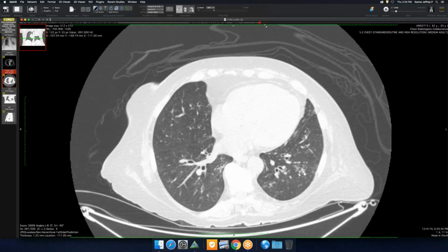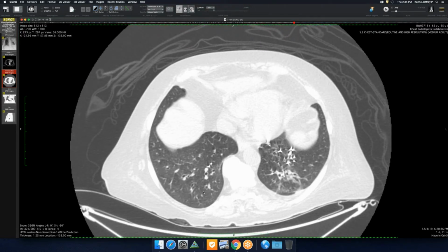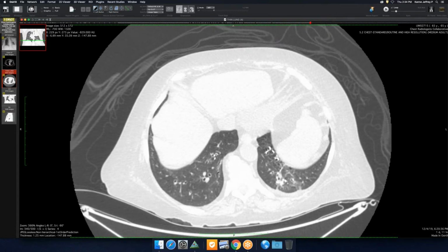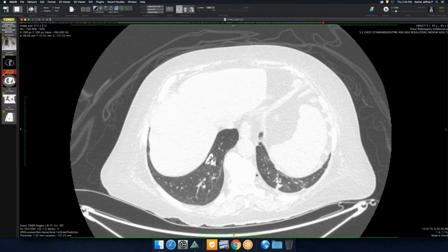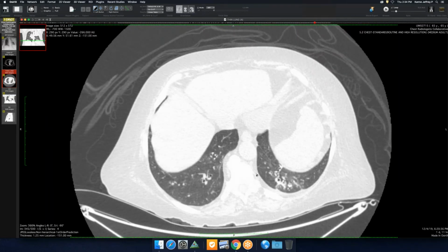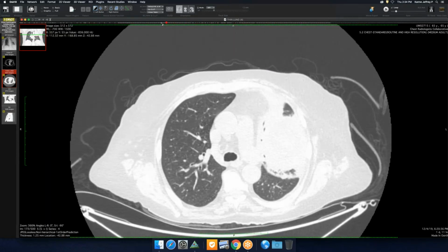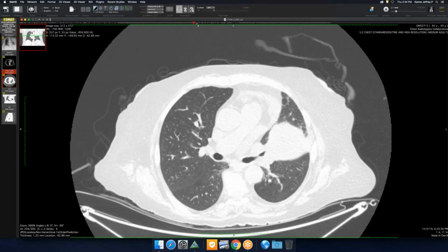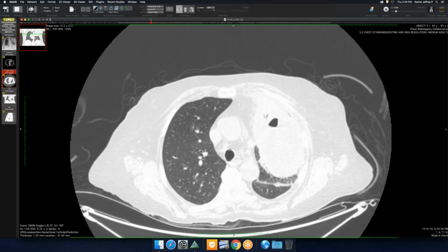It's kind of neat to see the barium in the lower lobes. Plus, you've got dilated airways and wall thickening, so this is a chronic aspiration. The presumption is this was aspiration leading to this lung abscess, but it's one of the larger abscesses I've ever seen. The primary team was pushing for a bronchoscopy, but you don't like to open these things up.